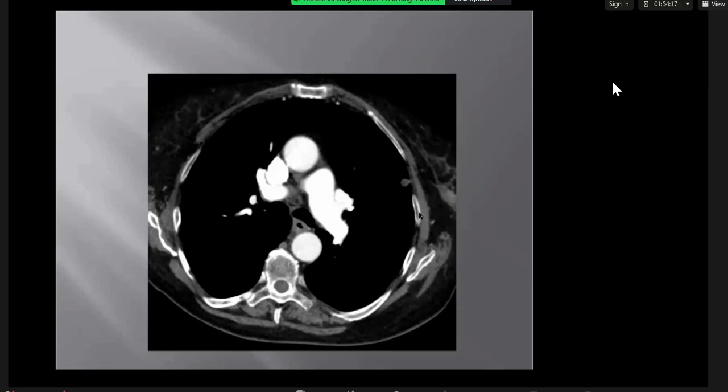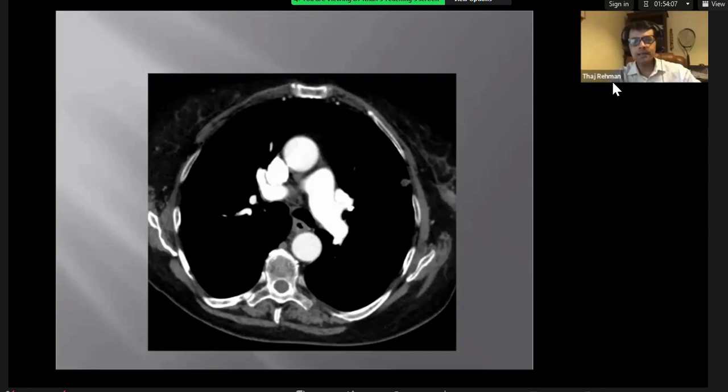All right. So, is it a hamartoma? I think there is a spot of fat within the lesion. Fantastic. Yeah, you did pick up that it's low density, you can say it's fatty density, isn't it? It does look like fat. Ideally you can measure the CT density, but that can be a bit tricky in the lung because there can be partial voluming.